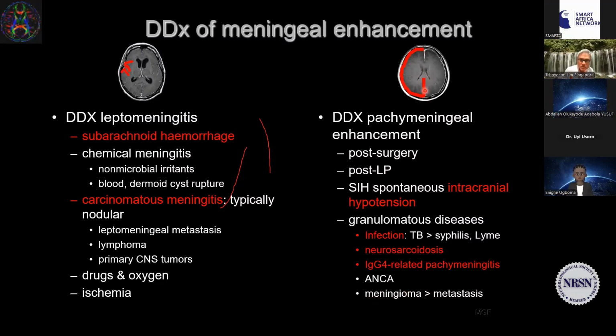In this patient with very diffuse bilateral dural enhancement, the cause was intracranial hypotension, what was called SIH.